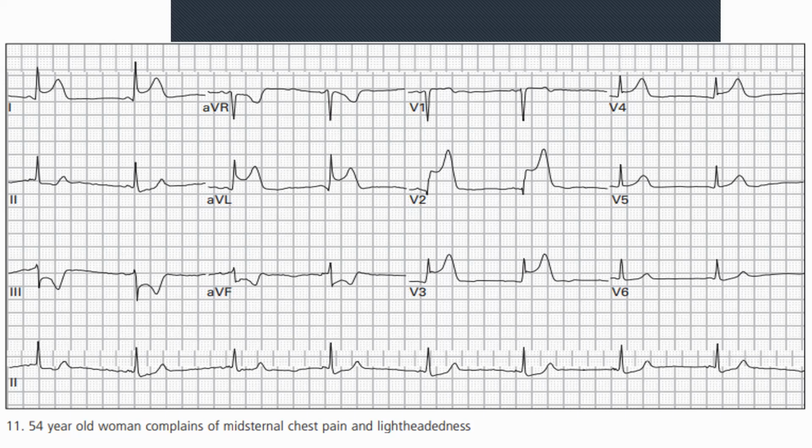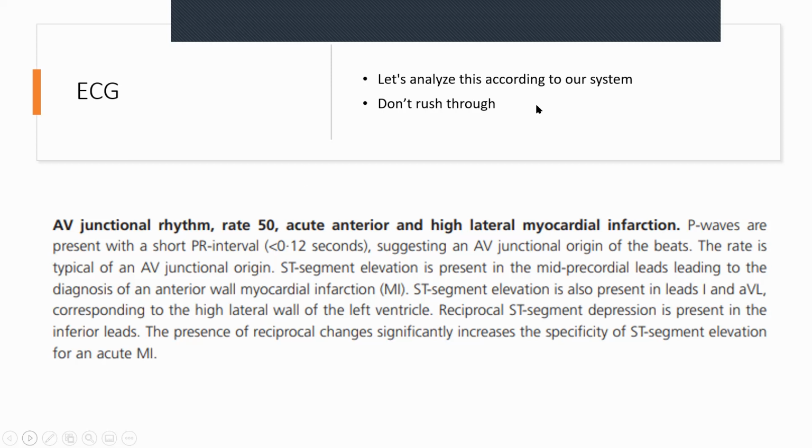So why I've concentrated on infarcts for the last 2 days is because I noticed some of the guys were having a bit of problems, just to get us back into it. So let's have a look at the answer over here and see what we've got. The lightheadedness may be due to low BPs and things like that. So we'll try and stabilize this patient as much as possible.